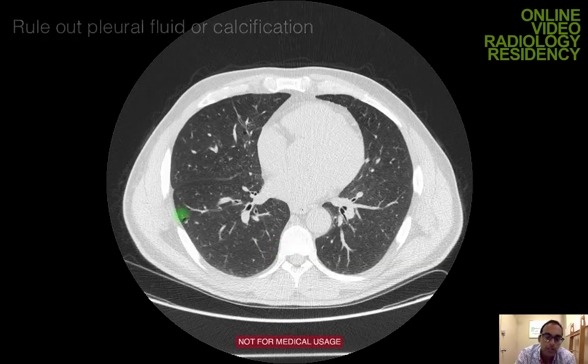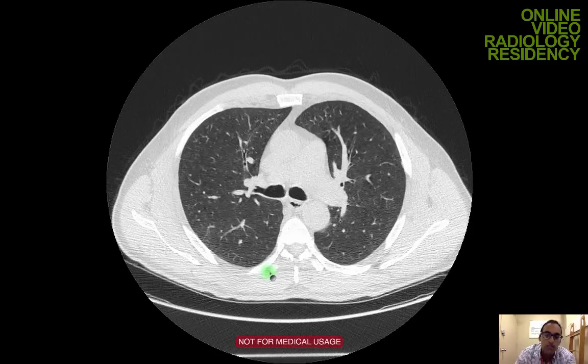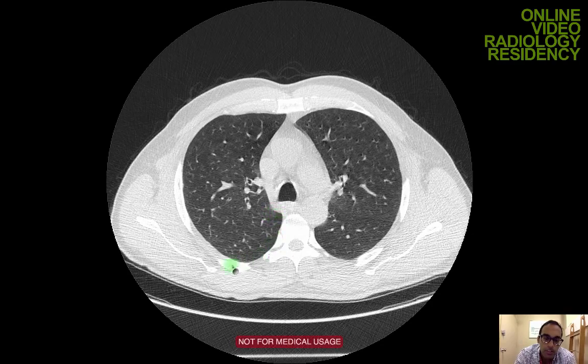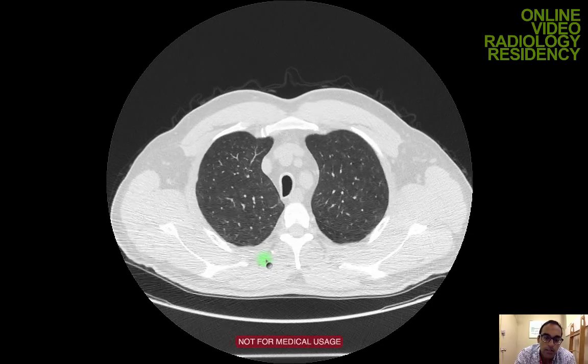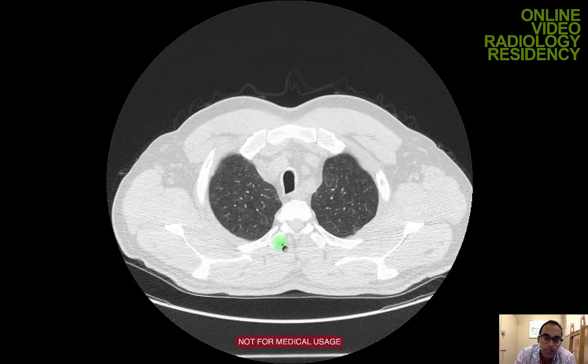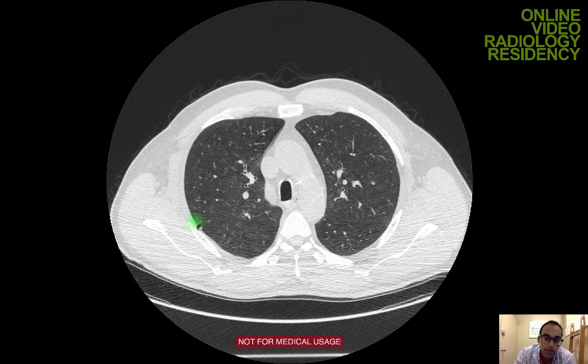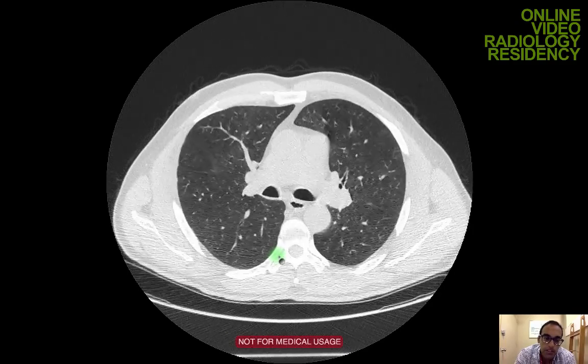One of the things, though, is that I make sure I look at the pleura on all parts of the chest because I don't want to miss less commonly found pleural findings, such as pleural calcifications or pleural nodularity, and there can rarely be pleural tumors. So I look anteriorly, posteriorly, laterally, and medially, looking for any pleural abnormalities, and look at each lung, knowing that if I don't specifically look at the pleura, I might miss some findings in the pleura.